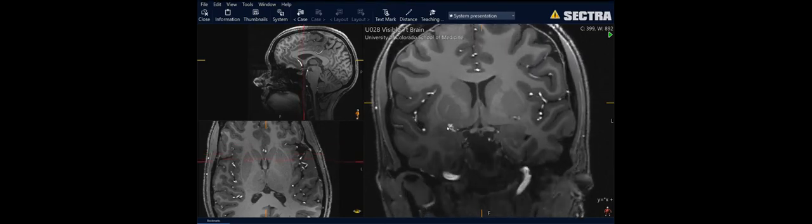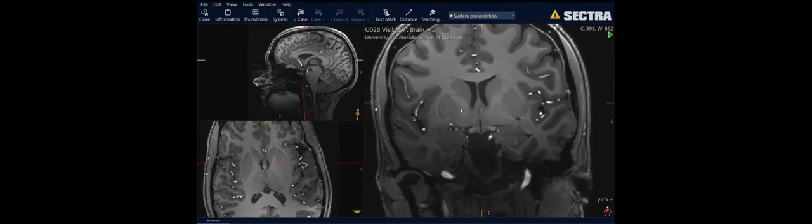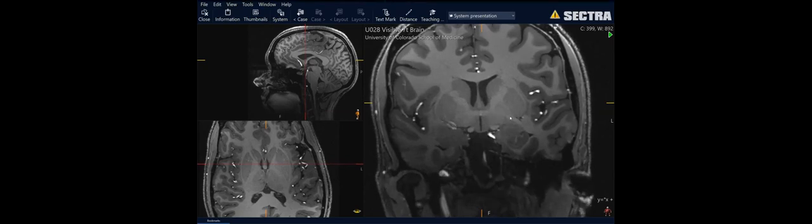And in fact, from that MCA, first branches we can see are those lenticulostriate branches, okay, immediately going superior to supply the lentiform nucleus and the striatum. So at this point, we've got putamen laterally, and we've got a nice distinguished lighter appearance of the globus pallidus. And we see these transversely oriented fibers. It's the anterior commissure, okay, above the third ventricle, which we can see. So at this point, we've got optic tracts, third ventricle.